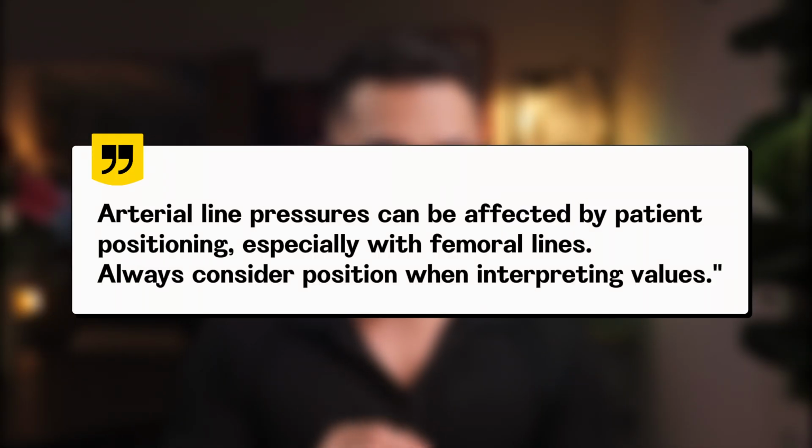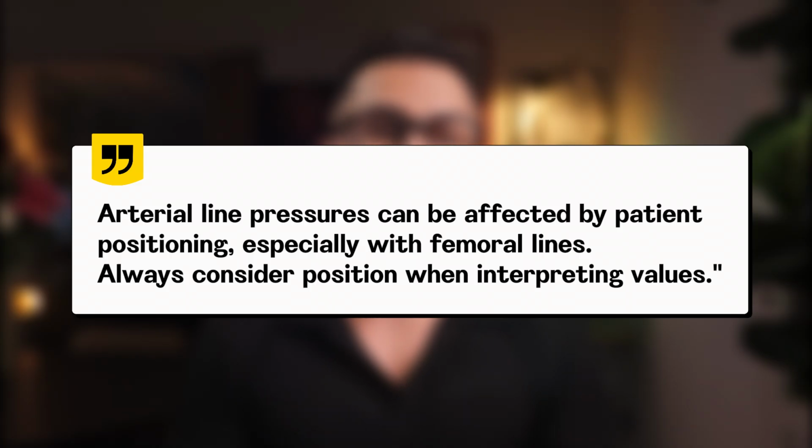And here's something most nurses don't know: arterial line pressures can be affected by patient positioning, especially with femoral lines. Always consider position when interpreting values.